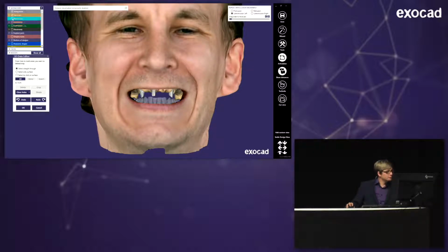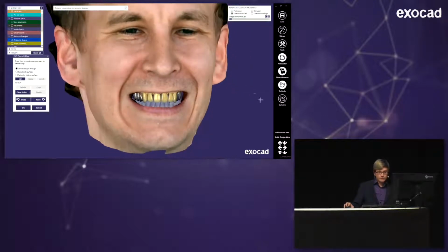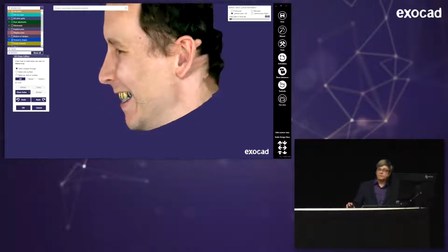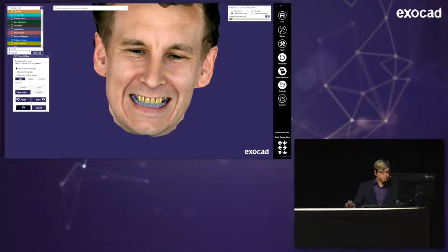I can actually show my models and my merged parts and my anatomy. And if I actually use smile design for that, I can get kind of an impression what it may look like, even from the sides. So, OK. So that's it for that case.